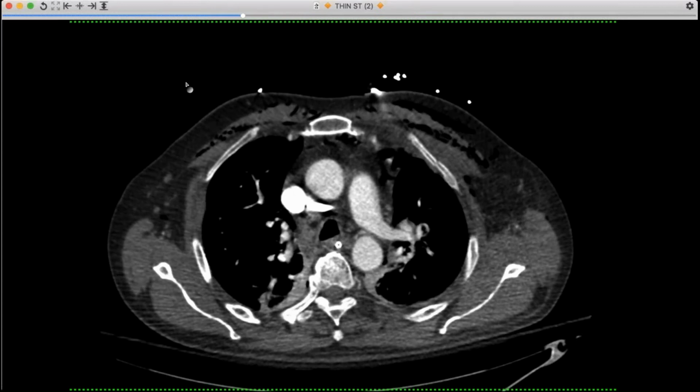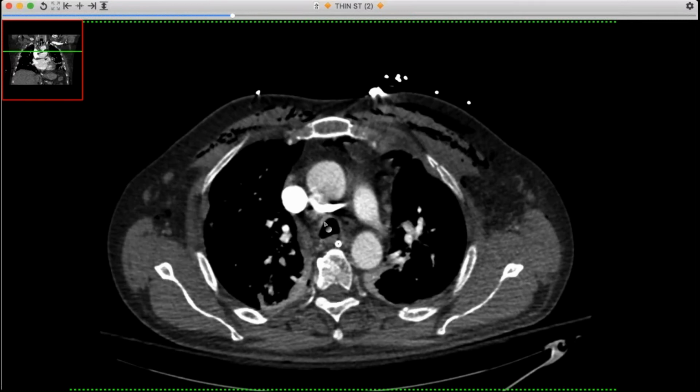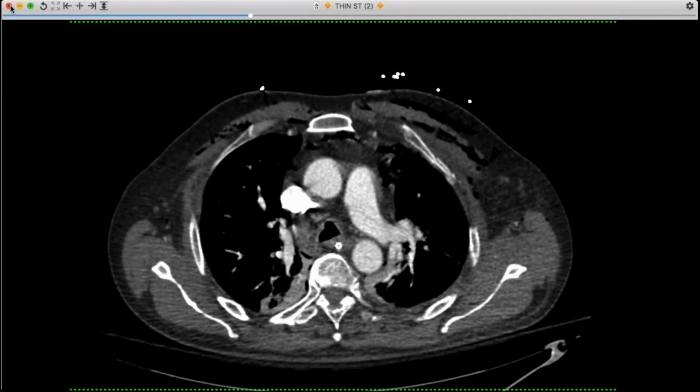That's interesting. Yeah, so just kind of a cute finding, and you can imagine it can have implications for PICC placement or other central venous catheter placement, and may take an odd-looking course, but it's a good-sized vessel, so a small catheter would pose no problem, but it would have a very odd orientation.